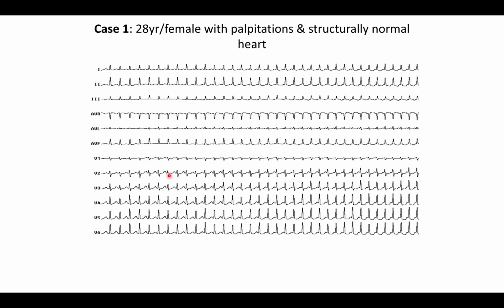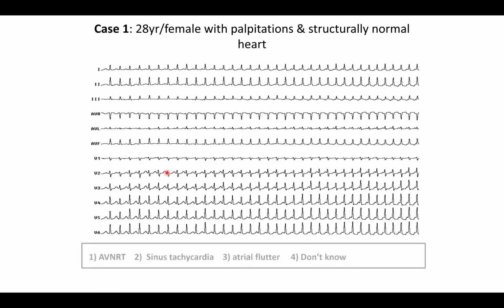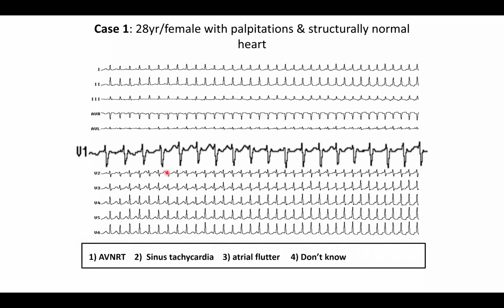So always remember, when you have a QRS, after that there is a low frequency wave, definitely this is a T wave. And we need to search for the P wave somewhere in the isoelectric segment or within the QRS. Just for our understanding, what I did, I highlighted lead V1. And I think we have read in a textbook usually that you search for the P wave either on the ST segment or in the distal part of the QRS, or maybe within the QRS.